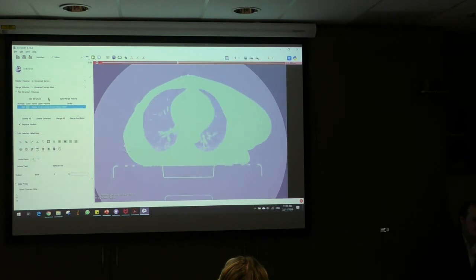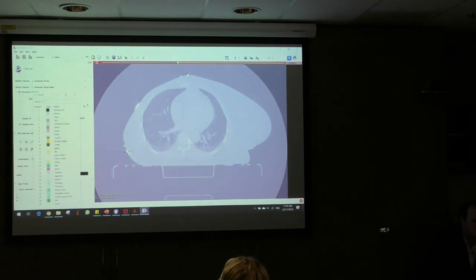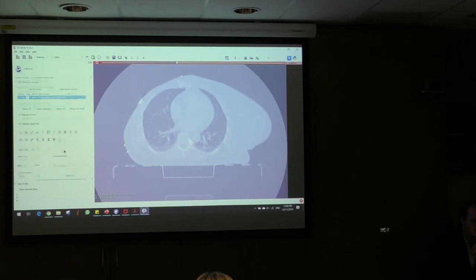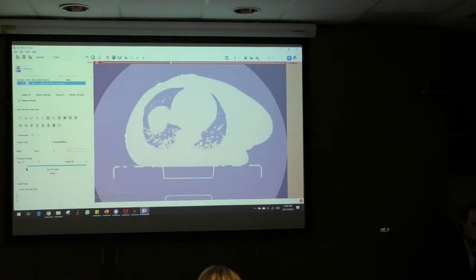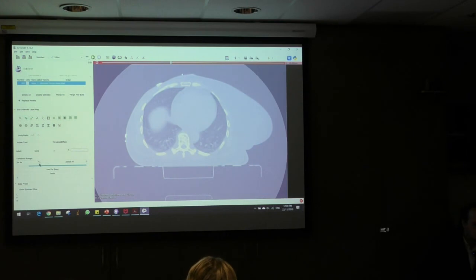So now we've saturated it, we might need to just quickly delete that structure. So we'll go into the bone and threshold, and then just need to find a sort of higher intensity. There it is. So yeah, it's a little bit tricky to get right.